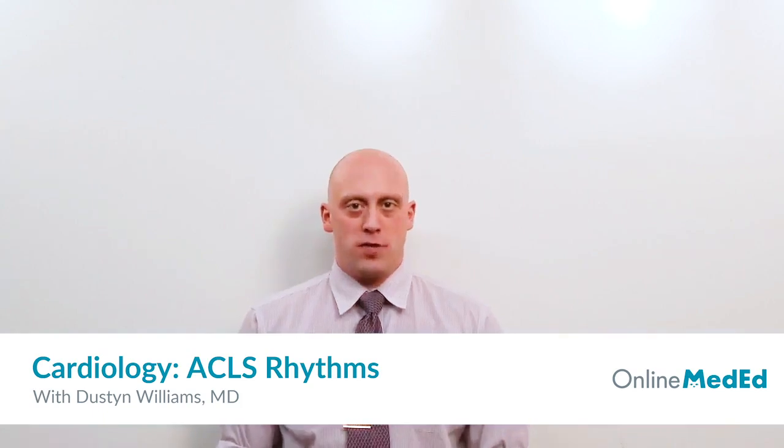Teaching the interpretation of an EKG is a fairly advanced skill. If you want to have the details of that, go check out the intern guide in the intern book. What I want to do in this video is talk about the different types of arrhythmias you're going to see on the test. On the test, it's more about pattern recognition than it is in real people. They're not going to give you one that's variable, it's going to be very clear.